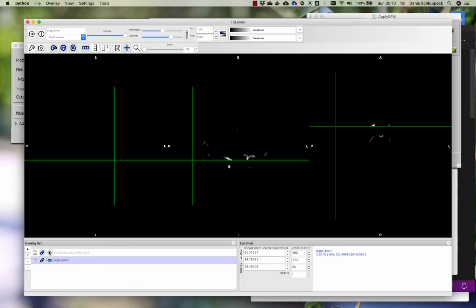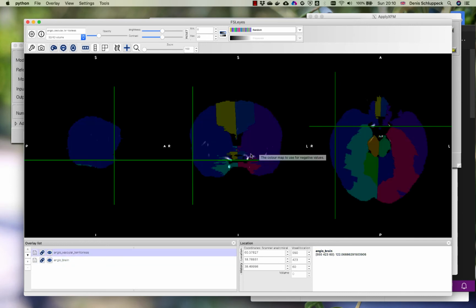If I superimpose this back on again, we can try and find out which parts of this underlying image are present in this yellow blob, in this blue blob, in the other blue blob, in this red one, and so on and so forth. Okay, so there's a way in which we can actually do this using one of the command line tools, so I want to do that next. Right, so this looks like it may have worked.